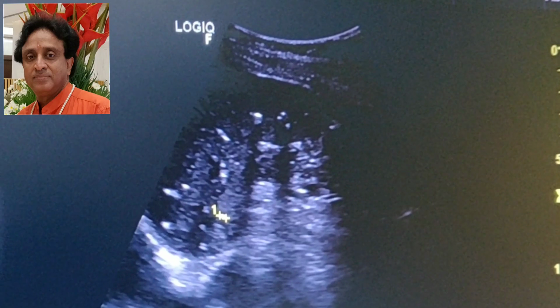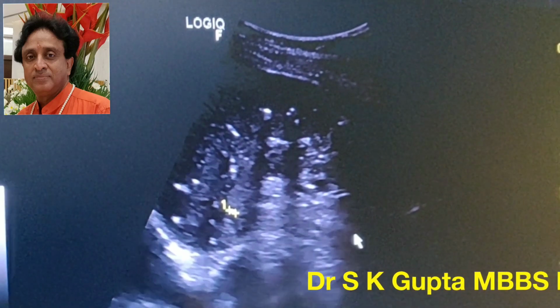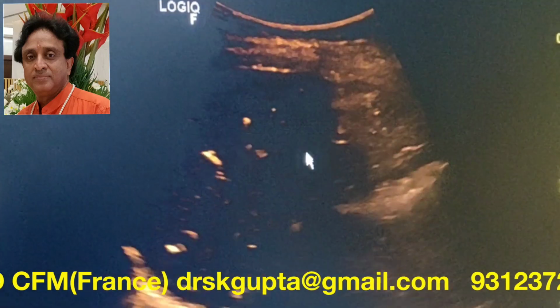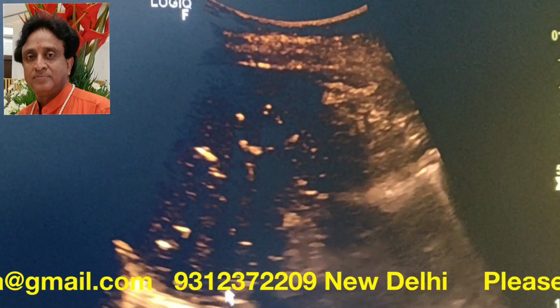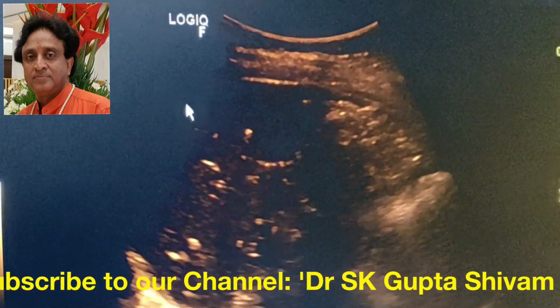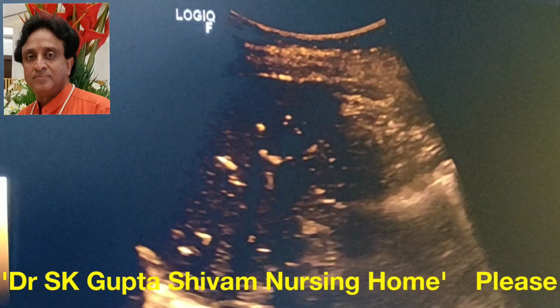all over the spleen, and these calcifications are occasionally seen on the ultrasound examination by the ultrasoundologist, because splenic calcifications are rare at times. The clinicians want to know what is the likely diagnosis.